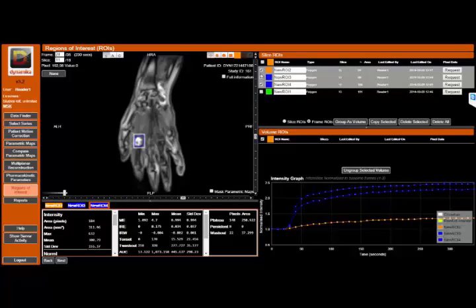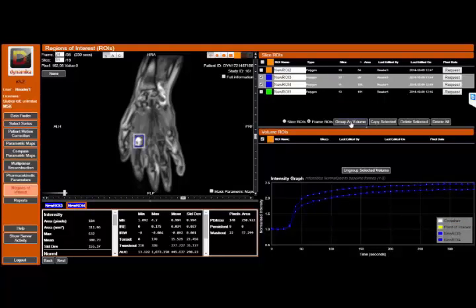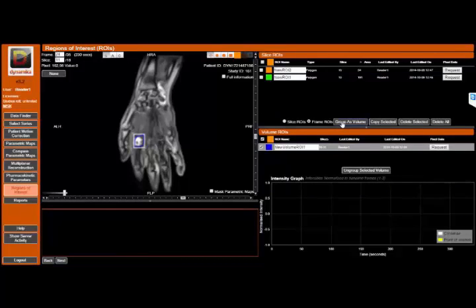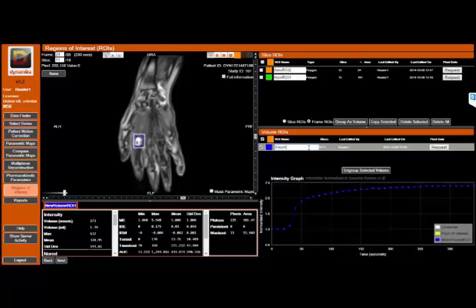I can take the two blue colors and put them into a blue volume. And then if I come down here to the volume ROI, which you can rename and, for instance, say volume density 2, this is the curve from that, the mean curve from that volume.